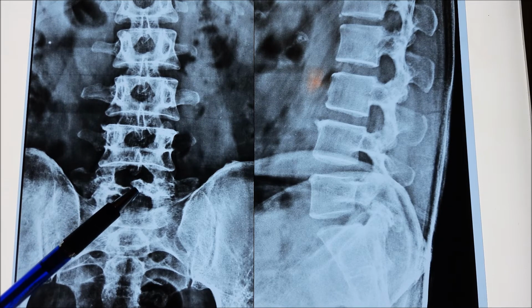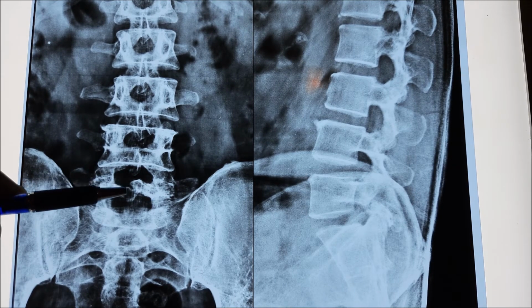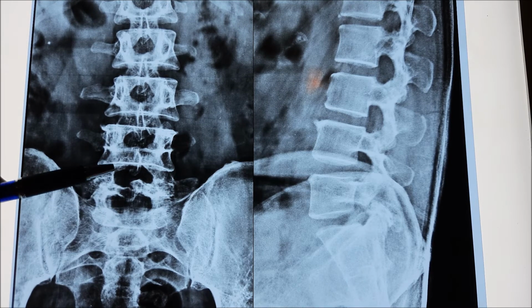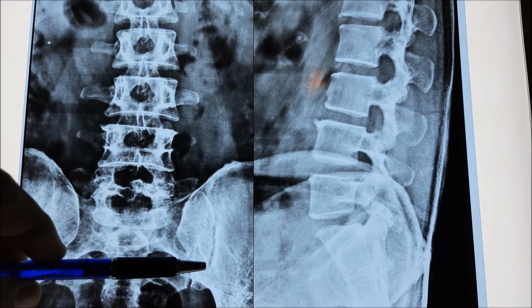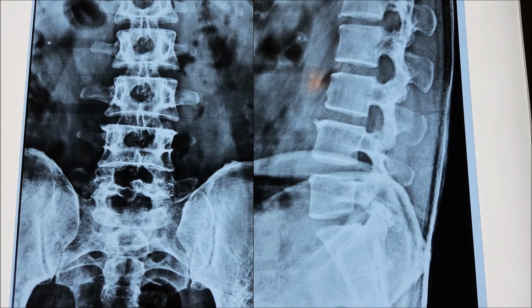So this is the second finding from his X-ray, that he is having an L5 spinous process fracture. Now coming to any other areas, anything we can see or not. When we went to the SI joints, yes, the margins are quite okay, so it does not have that much SI joint arthritis. Again, the curvature is in a neutral position, it's not in a tilt. Any other spinous process is okay.